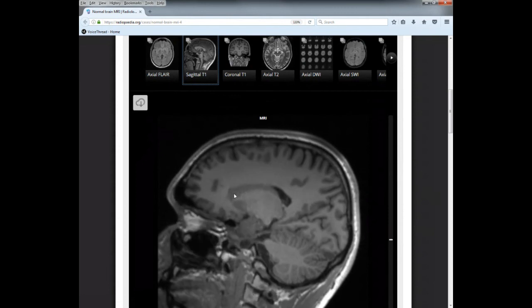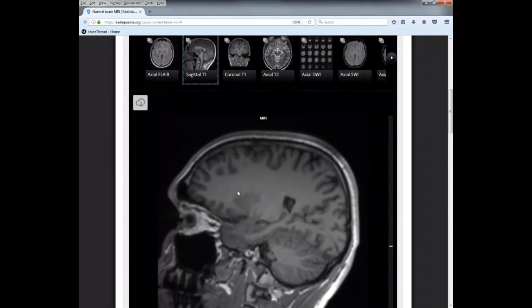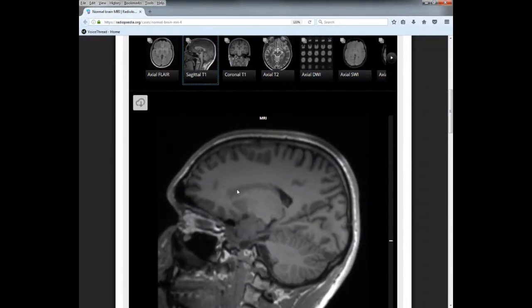Okay, remember they're islands of gray matter, and I've switched back to my T1, so it's actually going to look gray. Okay, lentiform, caudate right there. And then the space between, internal capsule, your river of white matter separating the lentiform and caudate nucleus.